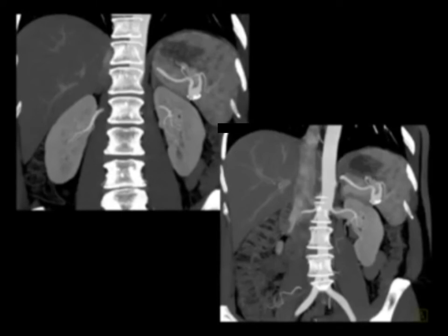This patient was referred to have that distal pancreatectomy, and the surgeon wanted to make sure the patient didn't have any liver mets. But look what a change it made. This patient would not need surgery.